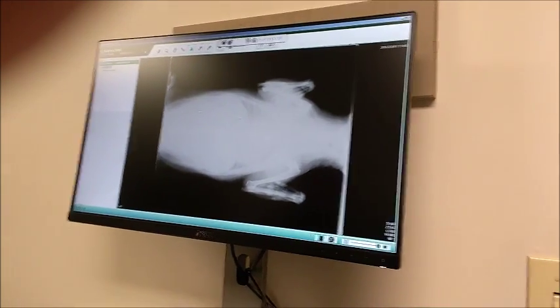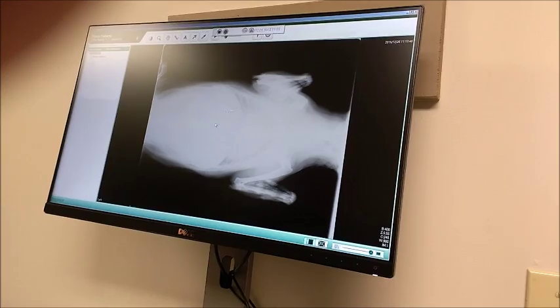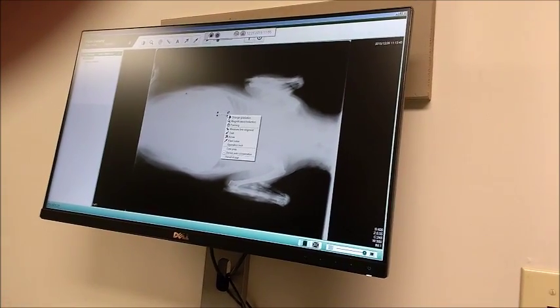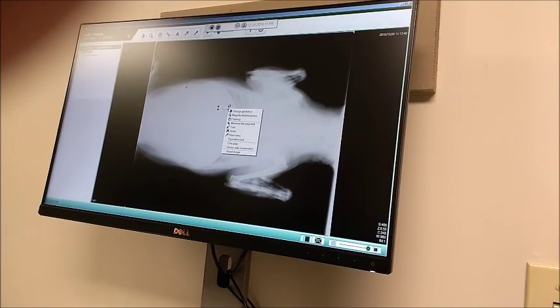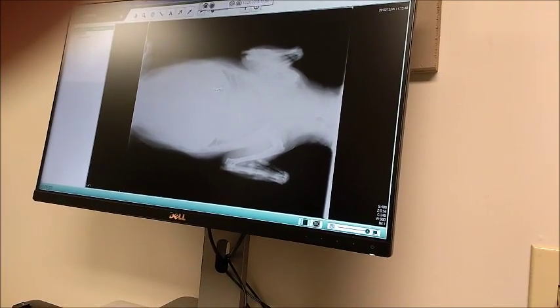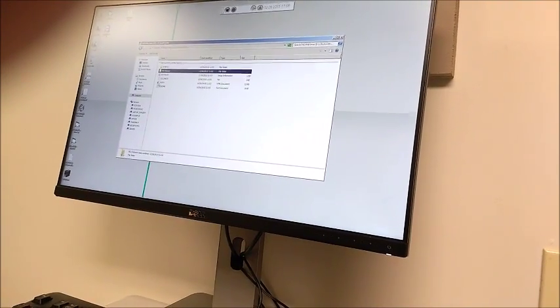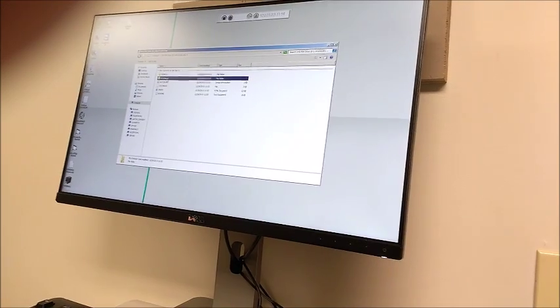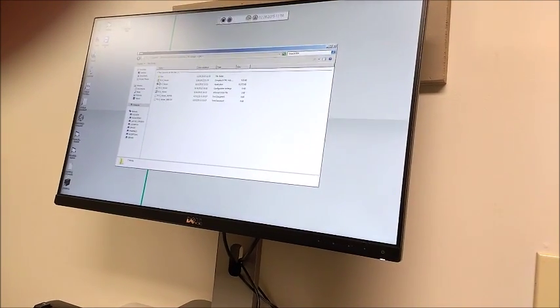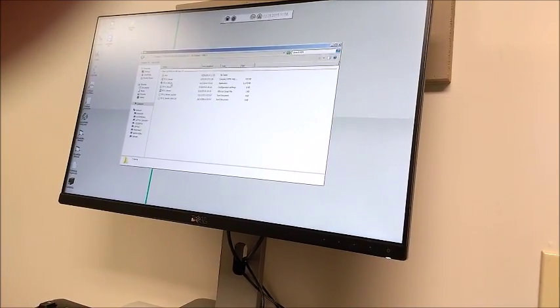But go back to where it was loaded. What did you click on to open it up? Go back to where the disk was loading, where it came up auto run and all this stuff. The PDS viewer is where I went, and then you had to go into this bin. They always use the application or the exe, so the application is the one I clicked on.